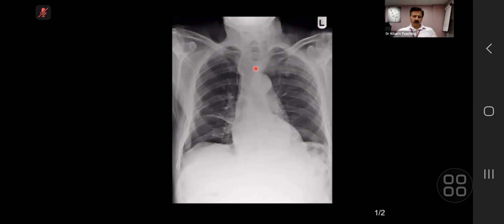Okay, well done. Achalasia is a very important film in the exam, a favorite, and they will always show you subtle signs on a chest X-ray. You have to look at this linear shadow here, which causes a double shadow of the mediastinal boundary. If you look carefully, there is a bit of dilatation here. Of course, right now we are doing esophagus, and you are so confident about it being achalasia, but in the real world, always keep it in your mind.